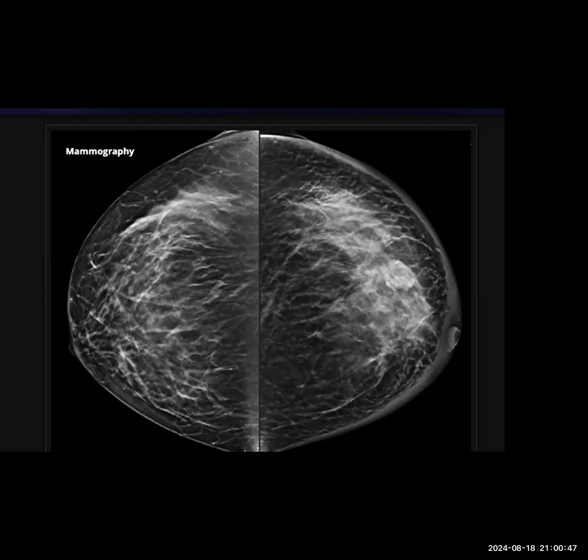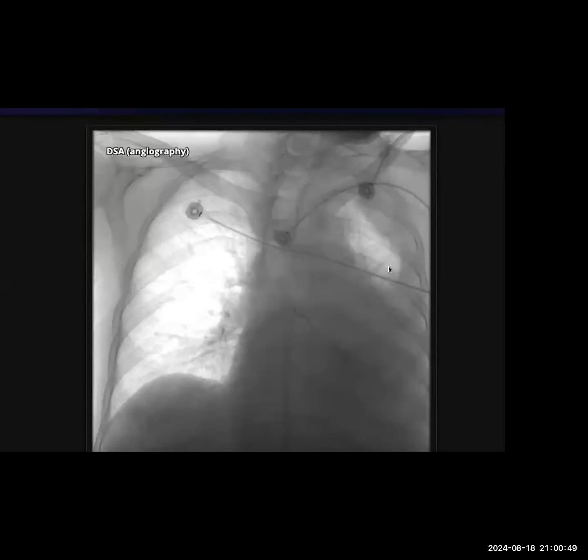We'll go to the next case. Yes, you can ask for control and scroll. Okay. Yeah, you can scroll. You have to tell me what study is being done. Sure.